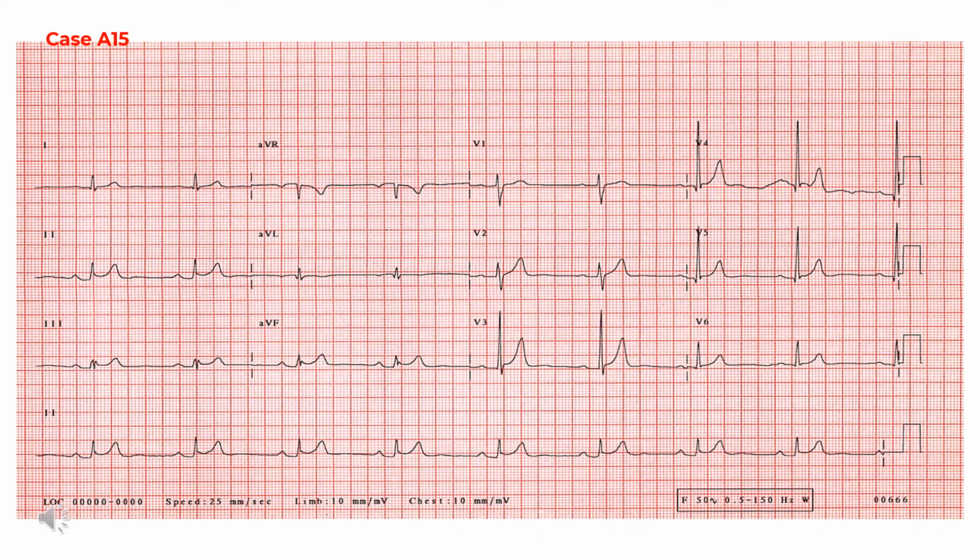Comment. The ECG shows the typical appearances of acute pericarditis. The morphology of the ST segment in pericarditis is often described as different to that seen in acute ischemia. The ST segments in pericarditis show the more concave upwards appearance seen in this case as opposed to the convex upwards appearance seen in early infarction.